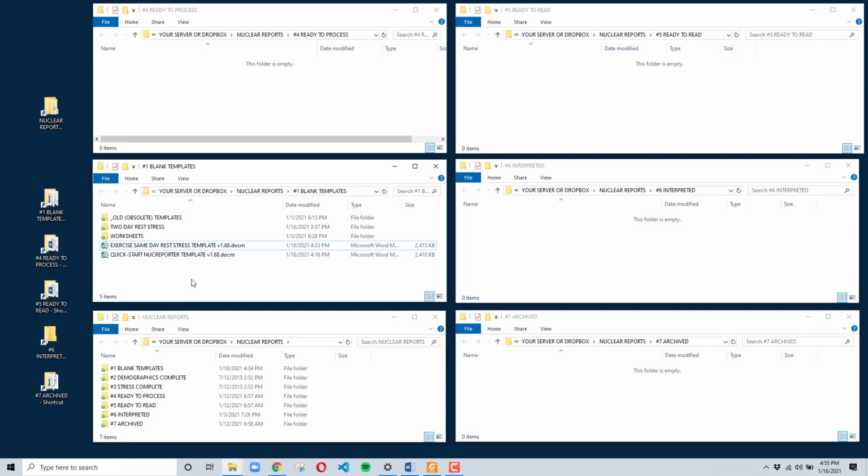And there's also thallium viability, PET rubidium 82, dual isotope, any kind of imaging protocol you can imagine, or stress test, dobutamine, just thallium redistribution if sestamibi is in short supply. All of that can be accommodated.